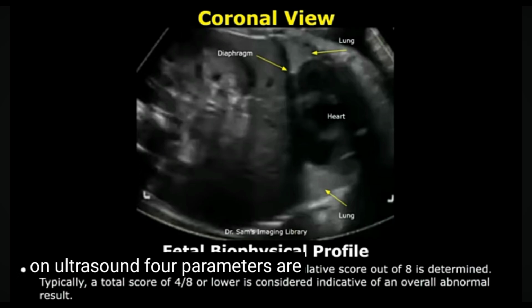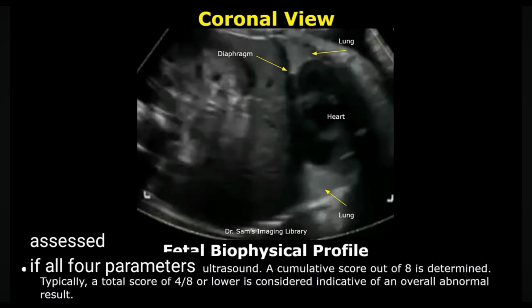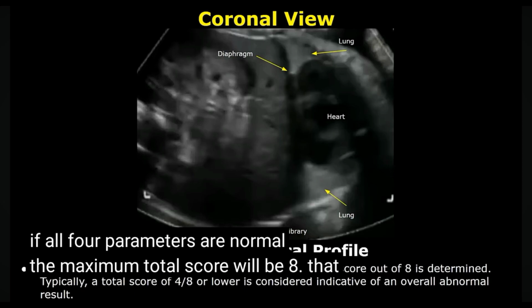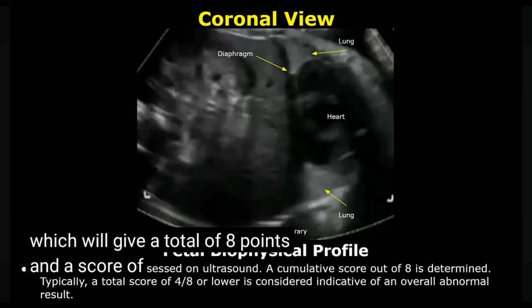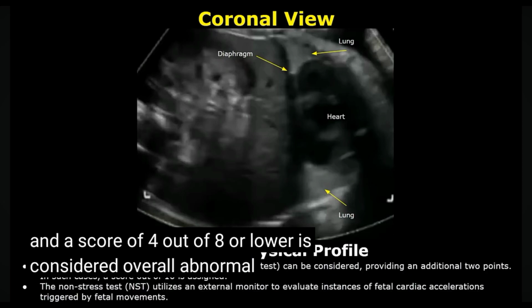On ultrasound, 4 parameters are assessed. If all 4 parameters are normal, the maximum total score will be 8. That is made by adding 2 from each parameter, which will give a total of 8 points, and a score of 4 out of 8 or lower is considered overall abnormal.